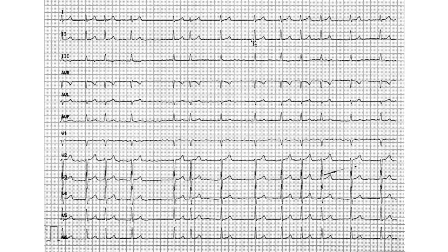So the next point: we describe point 1, point 2 is non-sinus, point 3 is the heart rate: 1, 2, 3, 4, 5, 6, 7, 8, 9, 10, 11, 12, 13 by 6, 78. Fourth point, describe the FF interval, and tell what the frequency of the F beats is.